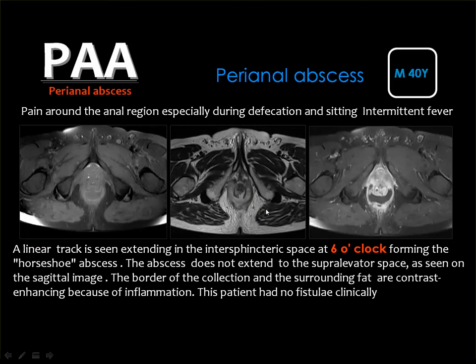You should know that anal abscesses may be associated with fistula and may not be associated with fistula. Here you have only an abscess which is located in the intersphincteric area, and you can see the opening of the abscess into the anal canal, but this patient had no fistulous opening externally.